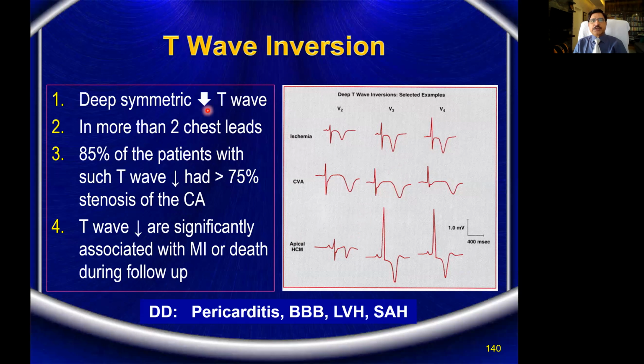Now, deep symmetric T inversions, these ischemic T inversions are like this, I told you. Okay, they are very deep, they are symmetric, they may be associated with ST depression also. Okay, in these leads you can see that.